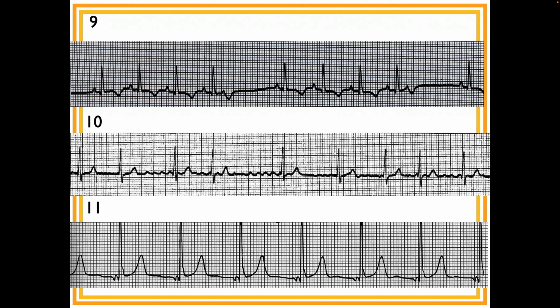However, remember, it's your job now, because you know about it, to look for non-conducted PACs. Look at what's normally happening, let me draw this one.